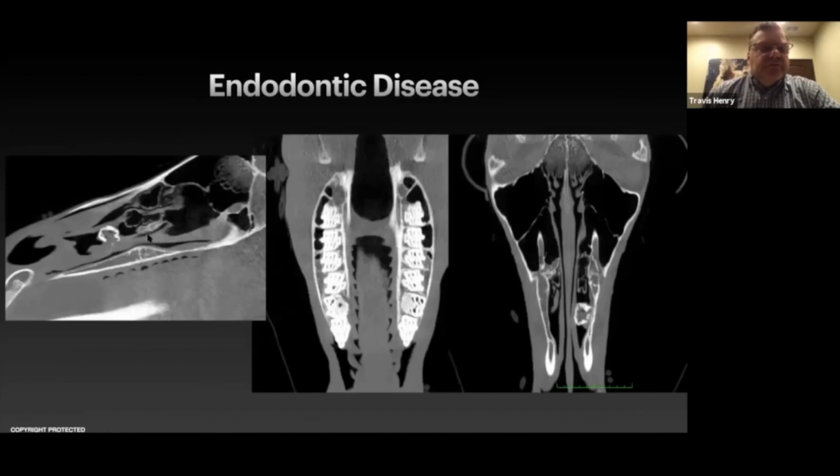So to just review, this is our sagittal of this horse, and we can see that cap of material that we presume to be dental material. Without a histopathology exam on this material, we can't say for sure, but it sure looks like the density of teeth, both on CT and radiograph. And then we've got dysplastic teeth here, and then the dental material here.